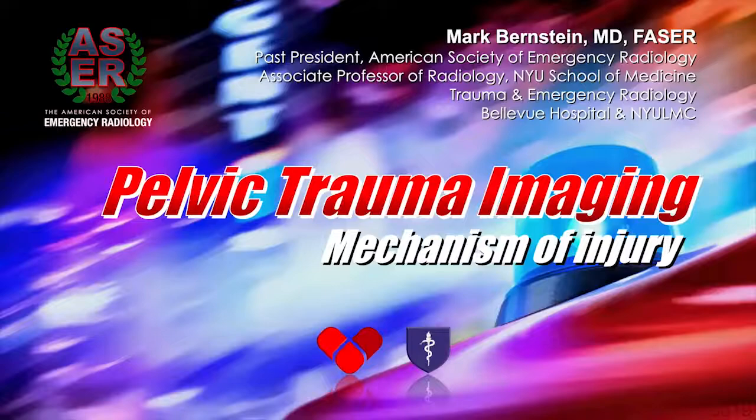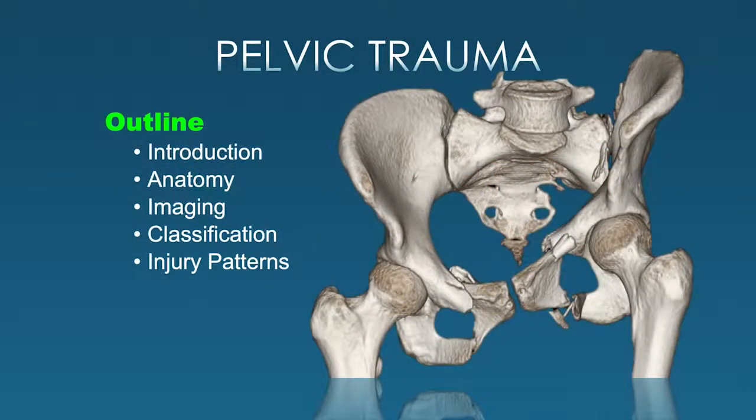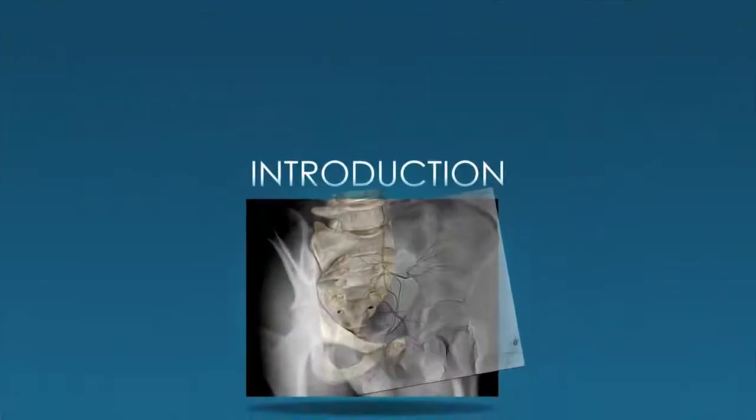We are going to discuss pelvic trauma imaging and basically focus on the mechanism of injury for the pelvic ring fractures in this episode here. We'll begin with an introduction, review some of the anatomy, talk about imaging, look at the classification, and spend much of the time looking at the classic injury patterns to recognize these.